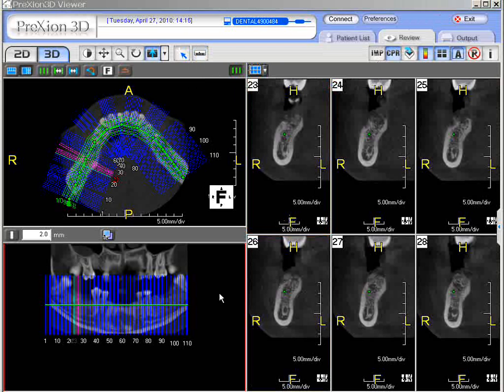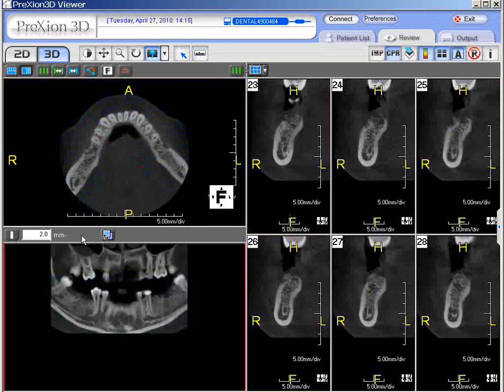Now, if you have the version where you have the orange dot here, what you could do is take, first of all, the visible cross-section lines off. Then you would click your orange dot. Now, it's not here because this is just a little bit later version. But you can left-click it and you can drop your orange dot into the canals here as you go. Okay, so now, if you have a version higher, what you have is this function here for implant planning.